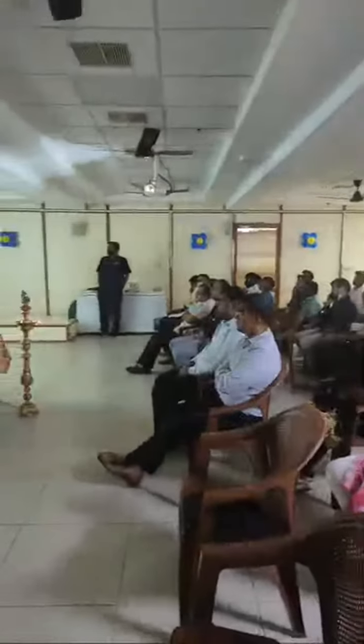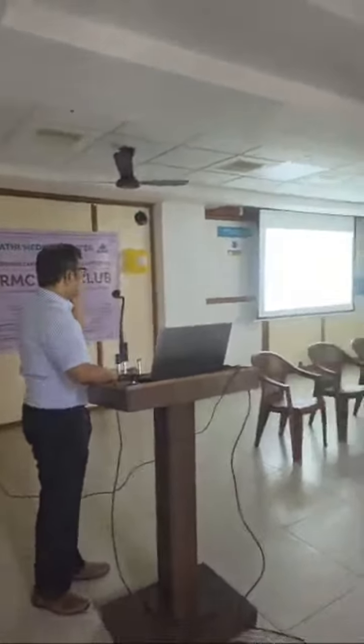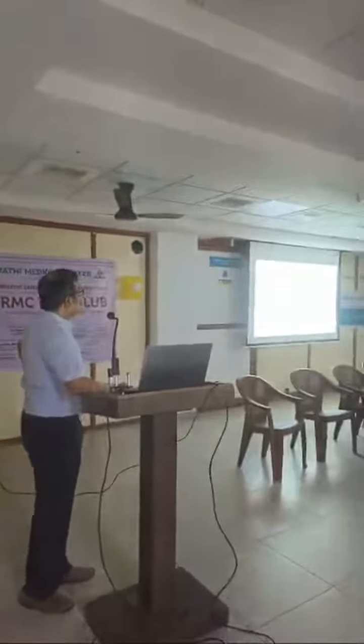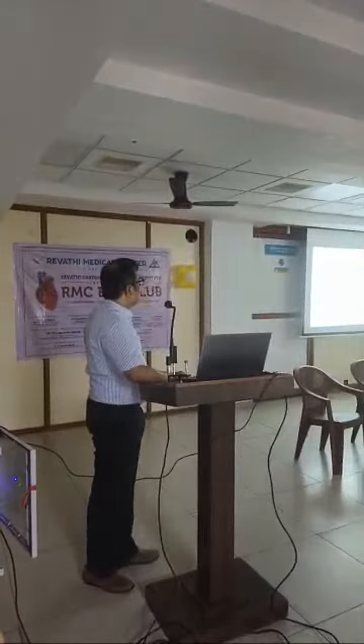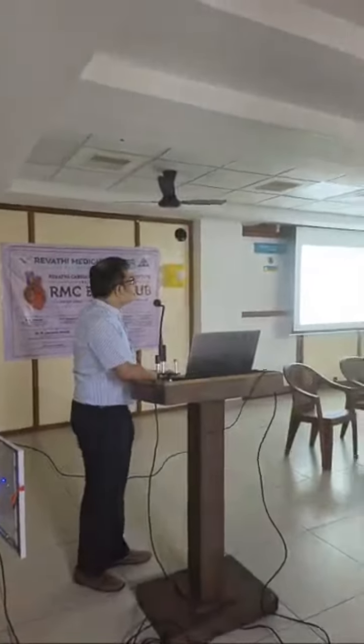So your next patient is a 60-year-old man with carcinoma of the stomach, who underwent total gastrectomy. Three days after, he becomes breathless and febrile, and had multiple ventricular ectopics with hemodynamic instability. He was intubated. Most of the common causes were ruled out. He was started on amiodarone infusion and slowly settled. After 24 hours, this is the ECG.